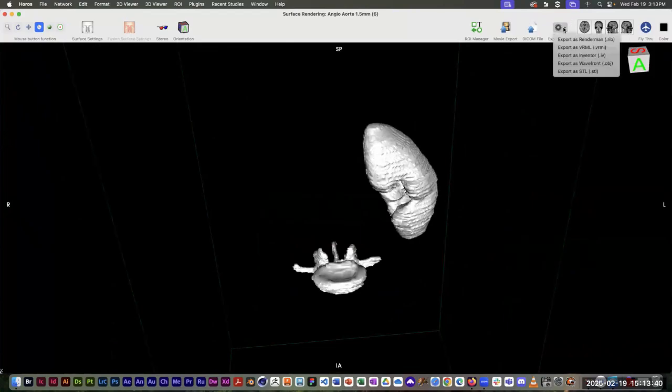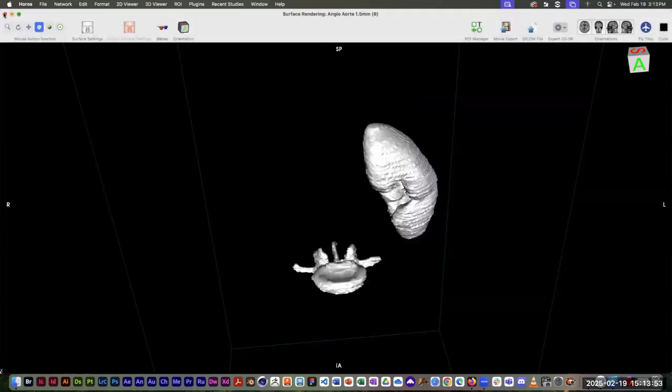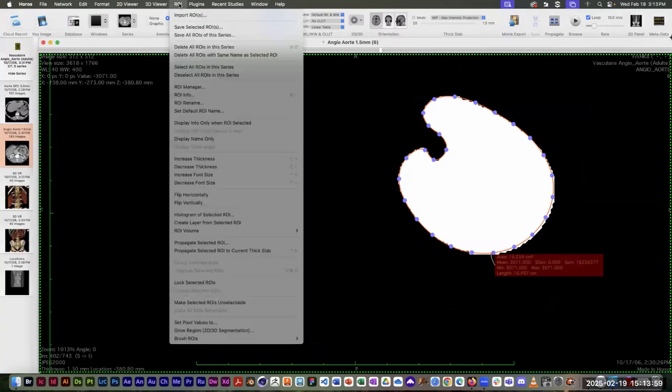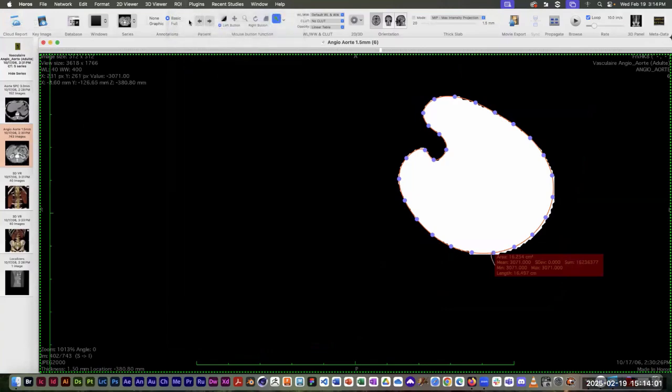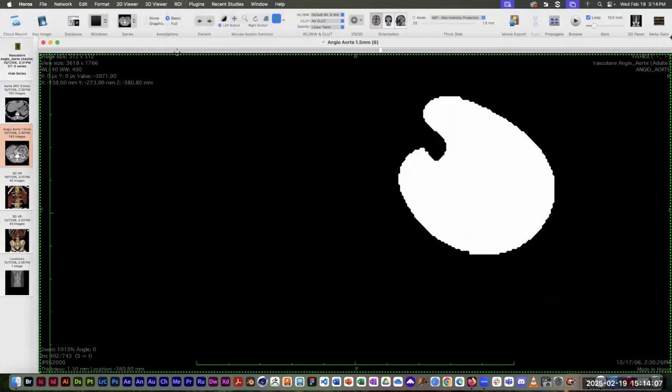But all right, we will go ahead and export this to an STL. We're going to call this mechanics kidney. And I'm going to try this again. Let's say select all regions of interest, delete all regions of interest in this series. I don't know.